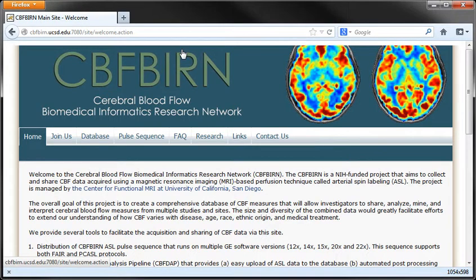In this tutorial, we will show you how to review the CBF maps created from the processing jobs started in the last video tutorial. Remember that we began with two sets of ASL data, one acquired under the control condition and the other after 200 milligrams of caffeine consumption from the same subject we named Mary Byrne. Also remember that each set was processed twice, one with and the other without spatial smoothing. So in all, we ran 4 CBF processing jobs, and therefore we will review 4 processed CBF maps.